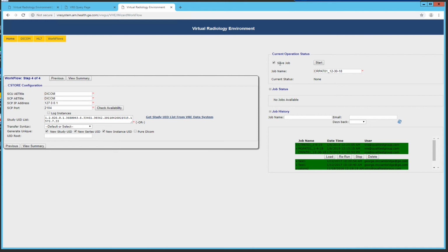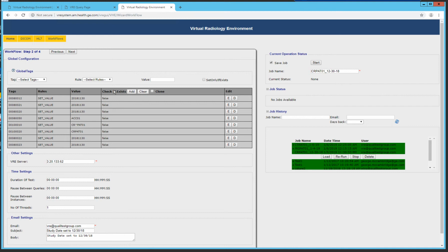And we will run this job. I'm going to choose not to save, well, let me save it. I will save this job. We called it, what was that, 11:30? 11:30, yeah. Let's put 11:30 for this job. Give it a new name, and I'll run it.